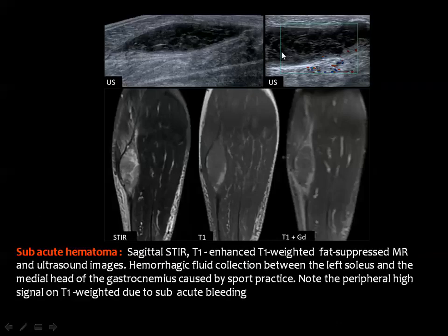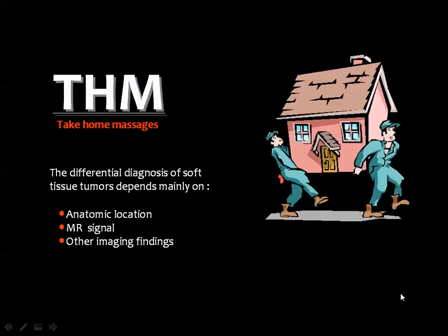Ultrasound and MRI of a muscle hematoma. Sometimes the patient is traumatized, he develops a hematoma that is frequently neglected. Then imaging at any time will show a mass within the muscle, which may not show the typical appearance of blood. Then it may be mistaken for a tumor, and this is a subacute hematoma in the muscle. This is T1 showing some bright signal of subacute blood, and this is the STIR image, and this is T1 post contrast. The lesion will not enhance with contrast.